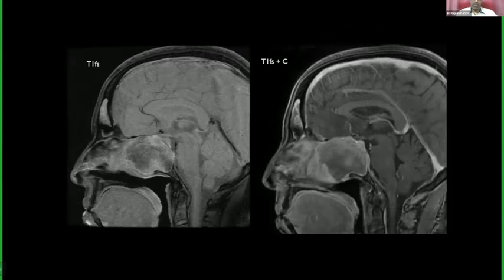That is a very important thing, and it is not possible to get that quality in the brain scan as compared to the rest of the body. So whenever we have a doubt, we can subtract the pre contrast from the post contrast, and then we can clearly demonstrate whether there is any enhancement or not. Okay, next.